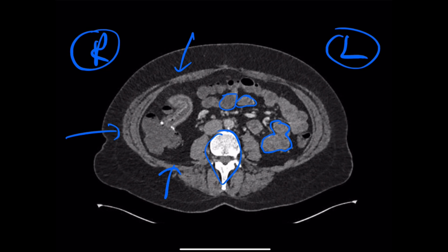Comparing it with the rest of the small bowel, that area doesn't look normal. Okay, why is it abnormal? It looks swollen. Well, why it's abnormal is the wall. Okay. The key is the wall. Look at this wall. It is thickened. It is significantly thickened when you compare it to somewhere like the normal small bowel there. Okay. And that's what draws our eye. And thickened. I'm going to say narrowed as well.